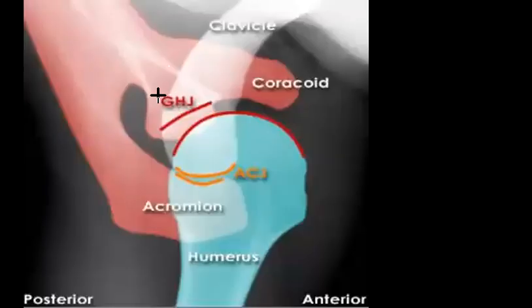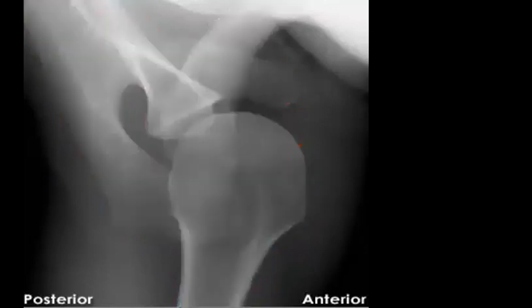And they like to show you this view, the axial view, to recognize the glenohumeral joint, the coracoid, again anteriorly, and the acromion posteriorly. Okay, and the acromioclavicular joint should be here. Yes. So this is the normal for the axial view. So now it's time to describe what is here.